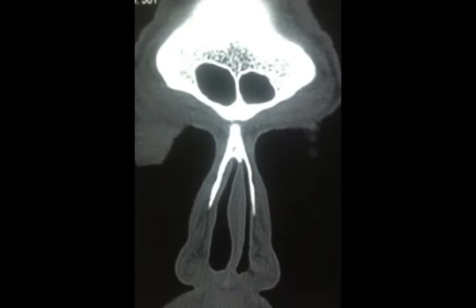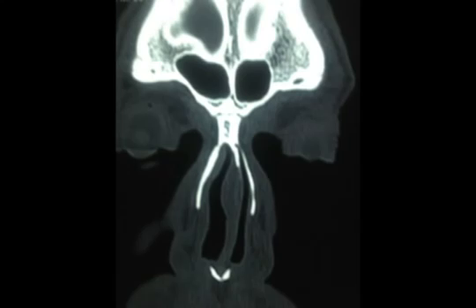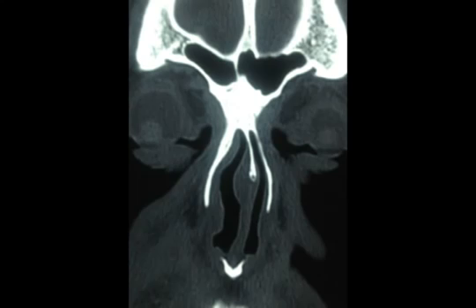frontal sinus on both sides, the ascending process of the maxilla, the cartilaginous portion of the nasal septum deviated to the left side. You can see the septal body is very prominent on the right side, and you can see the frontal sinuses and the nasal bone, the frontal nasal suture there. This cut shows the frontal sinus very clearly, the superior deviation of the nasal septum to the left side, and the septal body prominent on the right side.